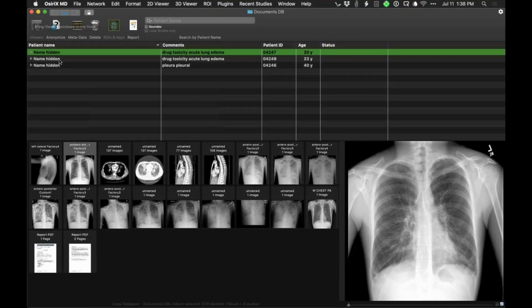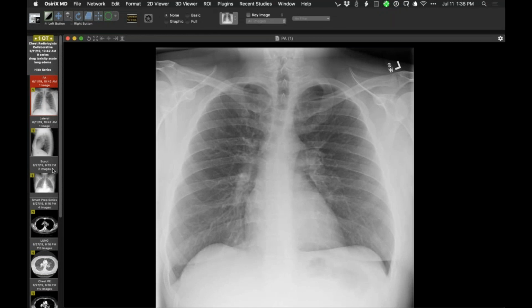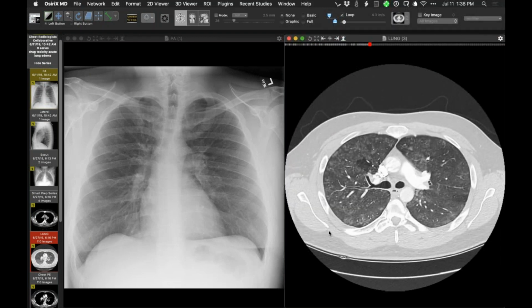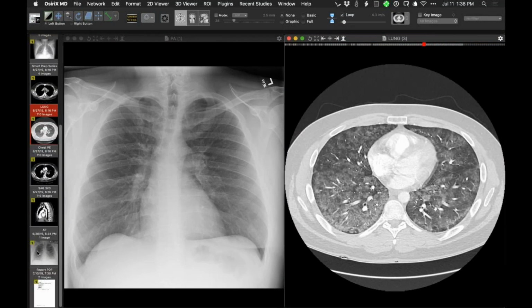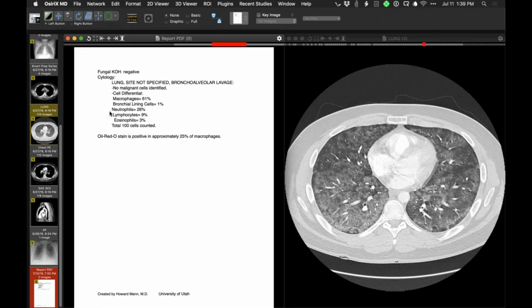So it turns out that not long thereafter, here's another person. This is coincidental, so let's take a look at this one. This one is June 11. He got ill, and I don't have radiographs between June 11 and 27th, but look at his lungs over here. Look at this person's lungs. And let's take a look at his parameters here. Let's see what I have for the cell count, 3% eosinophils here.